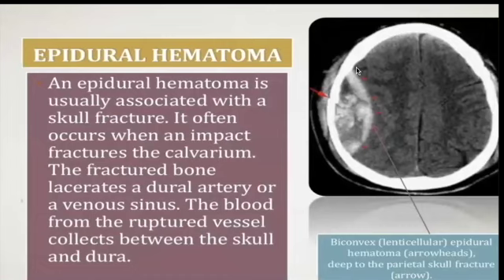So as I said, we're looking for a biconvex structure that looks like a lemon, as we see here on this side of the image. Now, as I said, with epidural hematomas, we're mostly thinking of patients who had a rupture of their middle meningeal arteries. These patients on their history will have something which we call a lucid interval. Does anyone know what a lucid interval is? Any idea? You can use the chat box. So maybe no one has discussed that with you yet.